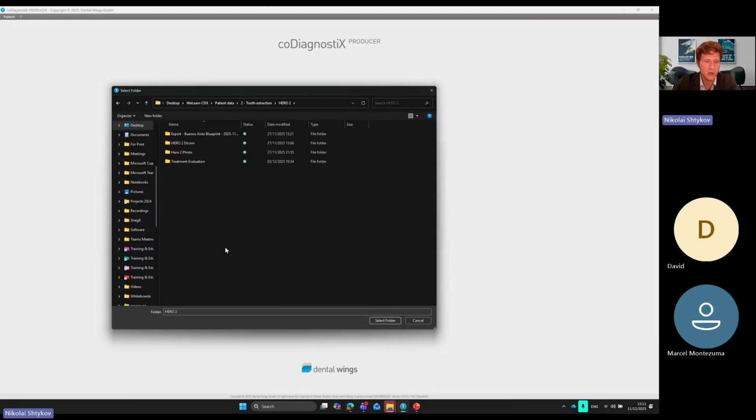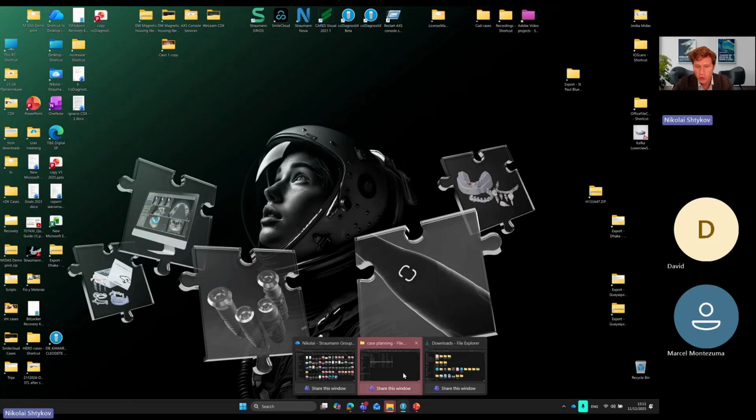The patient name is Hero 2. And here, for example, in Hero 2, I have Hero 2 DICOM. If I open this folder here, I cannot see anything inside. Let me show you.